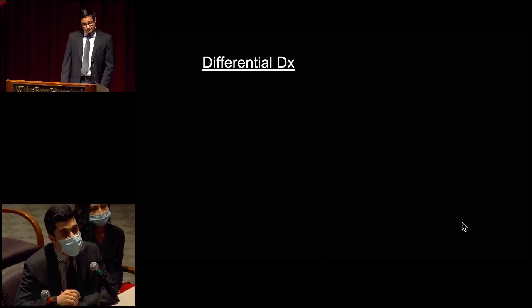And then choroidal masses that could be exudative, like melanoma, hemangioma, though it would be very unusual to be bilateral like that. That would be my... Does she have any history of paraproteinemia? She did not. I'm just trying to think of some way to tie this together with the chemosis that you described initially, and thinking maybe some of those exudates are oncotic in origin.